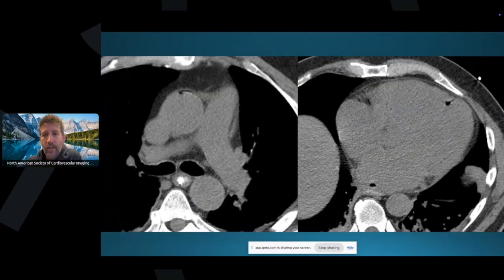And then we did a CT esophagram. You can see that there's oral contrast in the esophagus. This CT did not have IV contrast. And we see here three very, very ominous findings. One, on this one, here's the esophagus. We see a small pocket of air outside of the esophageal lumen, either between the atrium and the esophagus or within the atrium. Hard to tell in this image.